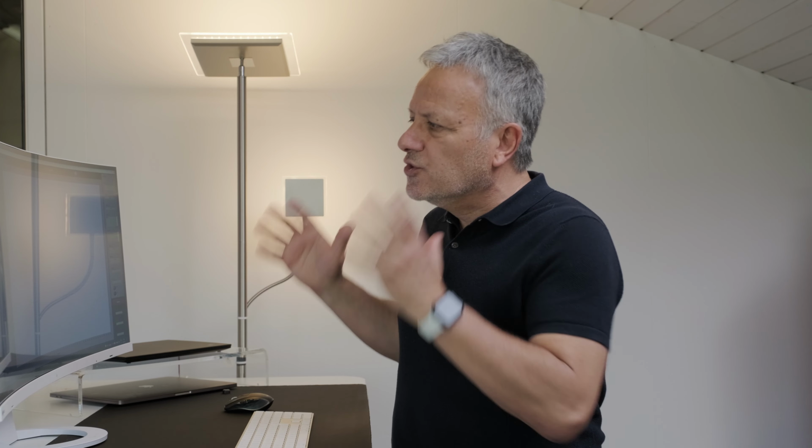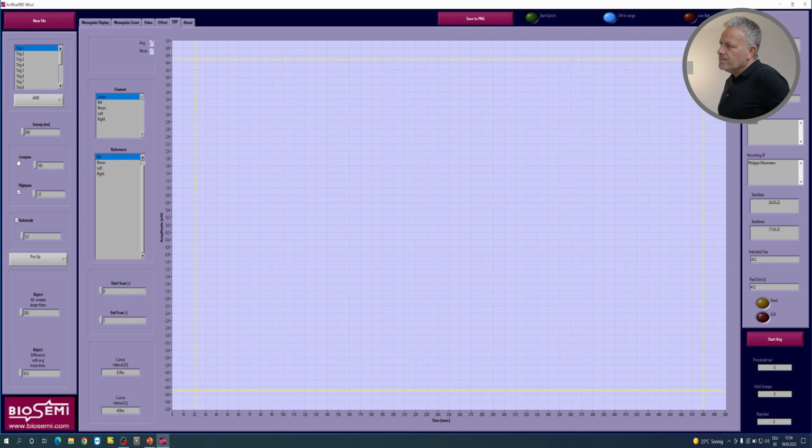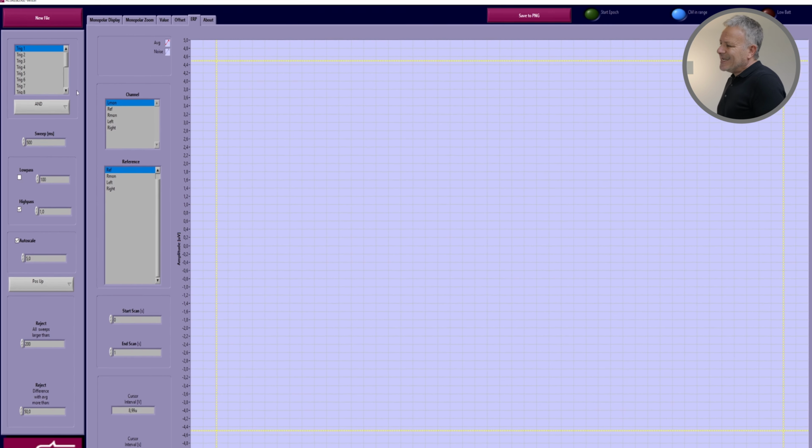And excuse me if I've given you so much information, but it's really, really handy to know. And by the amounts of emails we get from people asking questions and the forums full of questions, I thought to give you a real good rundown on what ActiRead or BESA or a file that we've acquired can actually do. All right, so here we go. We've got the ERP screen open. The file is already downloaded. It's already here. So what we need to do is a few settings.